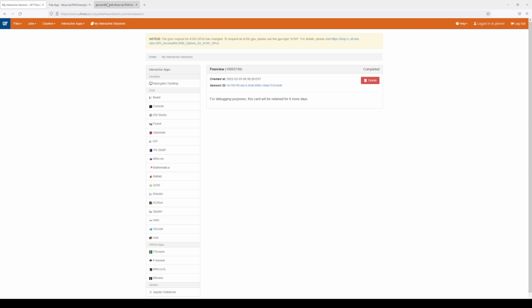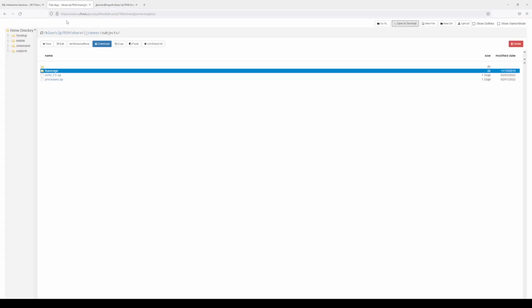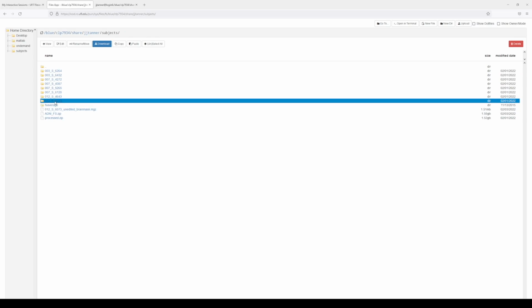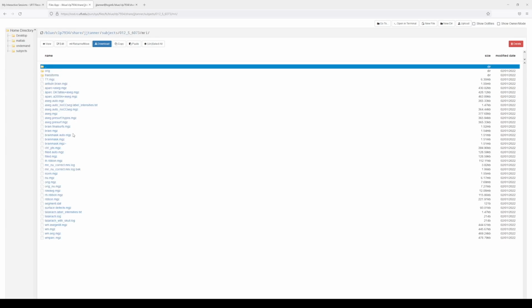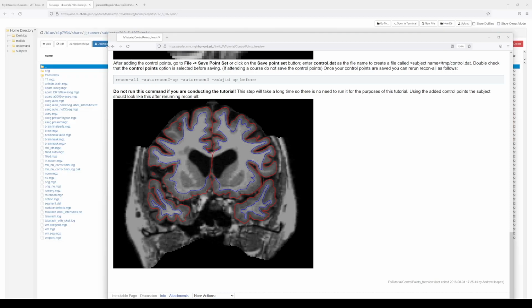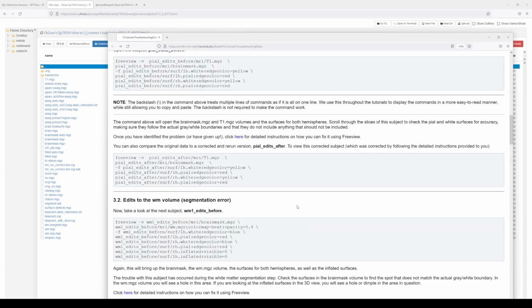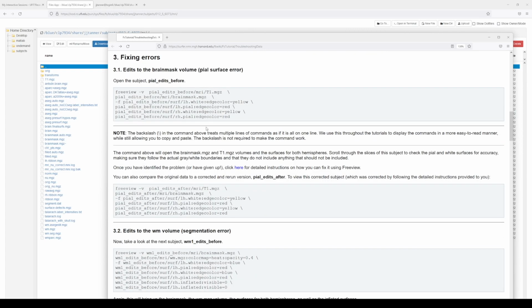And okay, so I edited this brain. Go to MRI, and then this brain mask. And here's sort of this unedited one that is making a backup as well. But this brain mask, let's figure out, okay, if I need to reprocess this, let's say that was really all I needed. The control points, I'm going to ignore that. And that can be an issue. But here, we edited the brain mask.